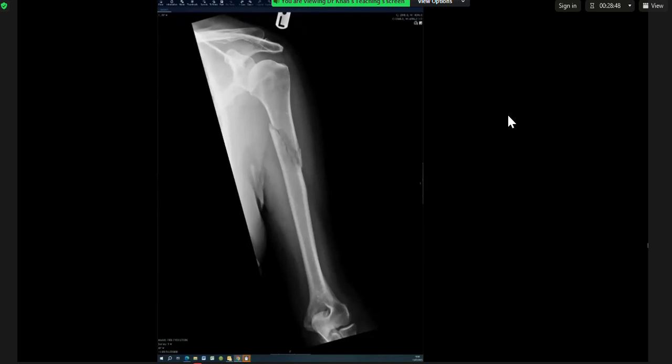Okay. In consultation with the MDT, I would arrange for a biopsy of this lesion, which will be done by the sarcoma team, and follow up with an MRI of this limb, including the upper and lower joints, for assessment of involvement and local staging. So when you said this could be a metastatic deposit or it could be primary bone, are these your two differentials, bone tumor or metastatic tumor? Yes. The primary could be anywhere, or this could be the primary, because it could be a primary bone malignancy.